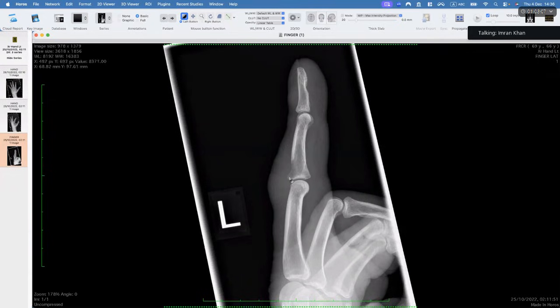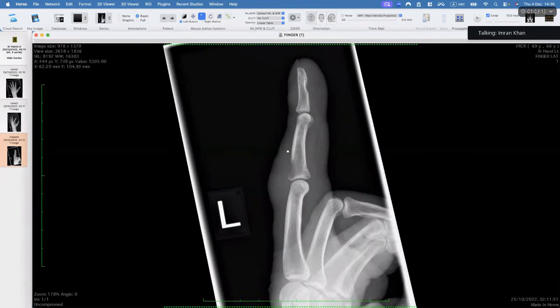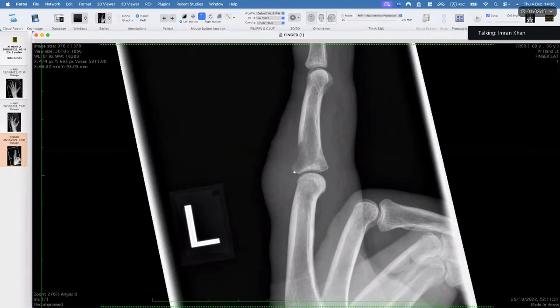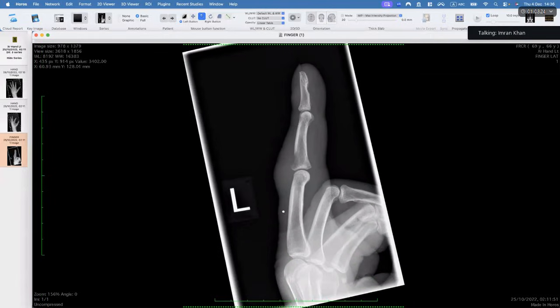So now you have to think of proper differentials. This periosteal reaction, and it's not exactly a lamellated periosteal reaction. It's actually kind of almost like a sunburst, a sun ray sort of periosteal reaction. So this is an aggressive process that's happening, not typical for tenosynovial giant cell tumors of the tendon sheath, which are fairly indolent sort of tumors.